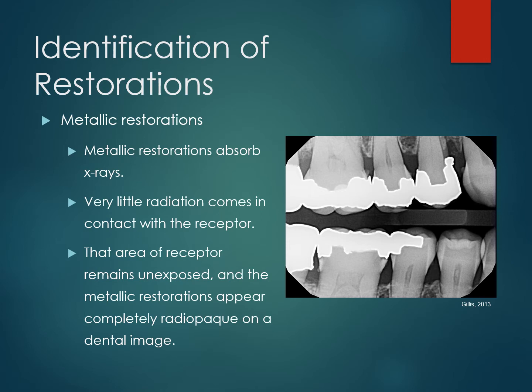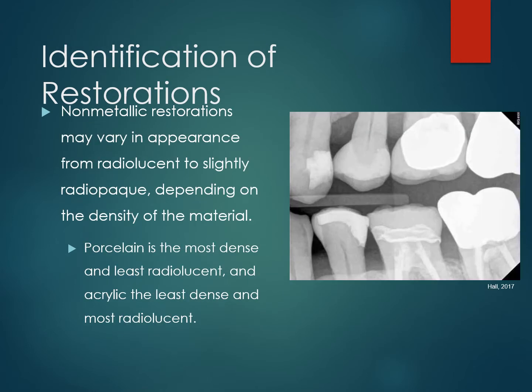So very little x-ray energy comes in contact with the receptor. That area of the receptor remains unexposed, and the metallic restorations appear completely radiopaque on a dental image. Non-metallic restorations are a little bit different. They are very different. Each type of material is different. They're not all going to look the same.